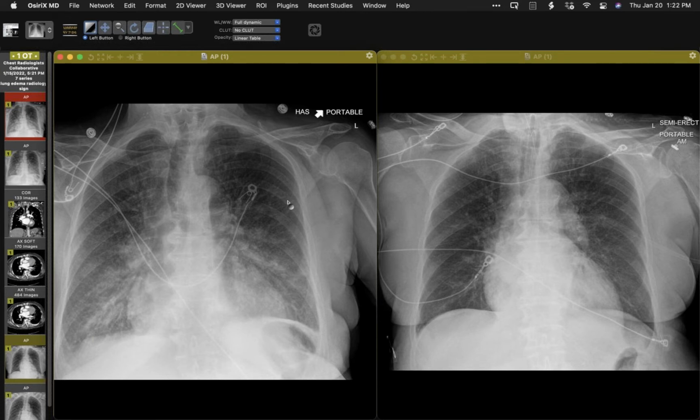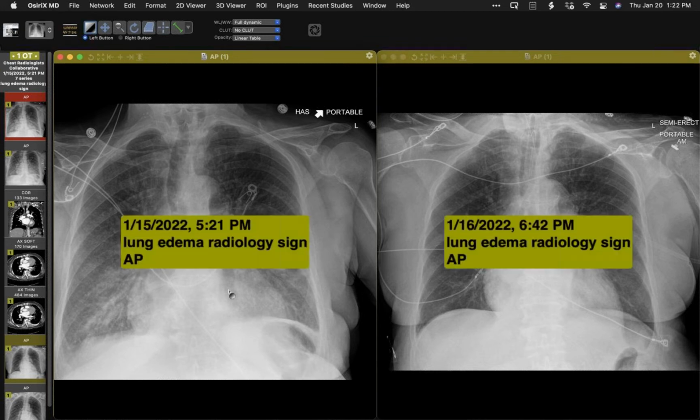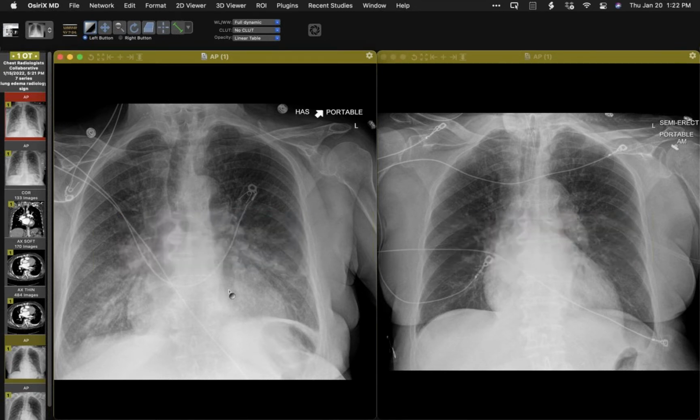The patient was intubated, but was also treated with diuretics. So at this time, by virtue of a history of CHF, a diagnosis of lung edema was made, hydrostatic lung edema from left atrial hypertension. And certainly the rapidity of the resolution of those opacities is quite consistent with resolution of lung water.